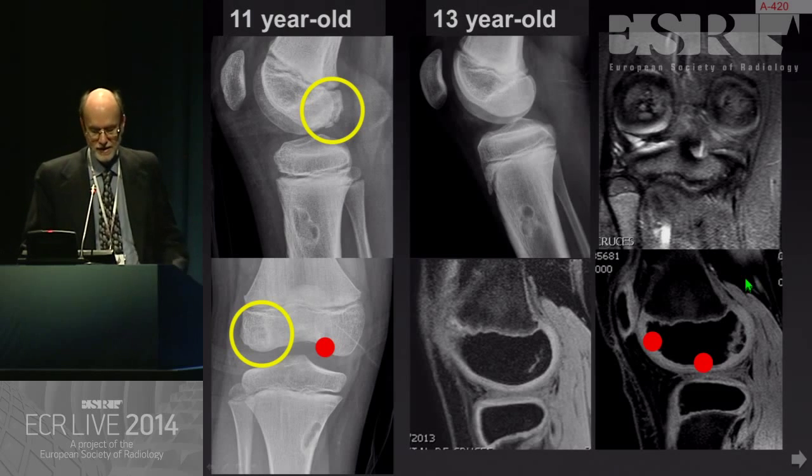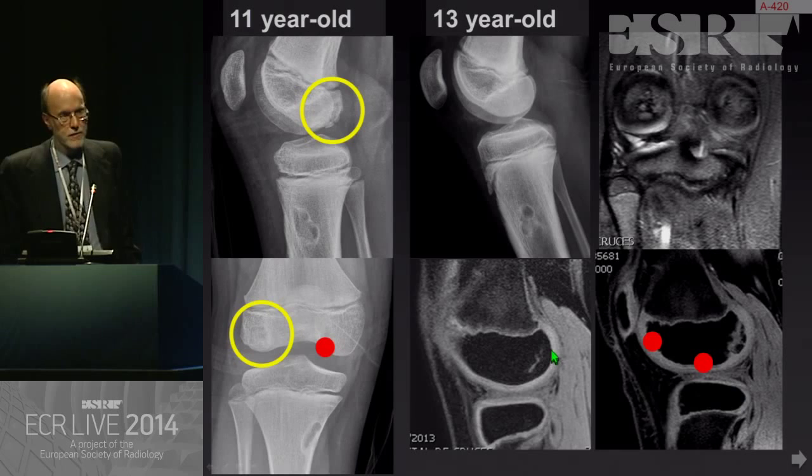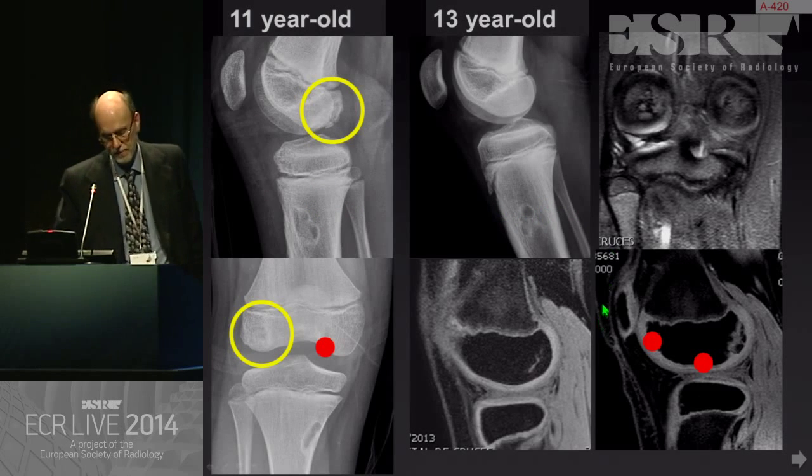Again, 2 years later, the patient came back because he had some vague diffuse pain, and you can see the change, absolutely smooth margin of both femoral condyles, and there is just a tiny line as a remnant of the fragmentation that was present 2 years ago. So this is absolutely normal, not to be confused with osteochondritis dissecans. There is some healing of the fibrous cortical defect, as was expected in this 2-year follow-up.